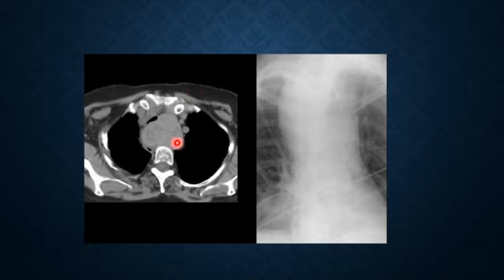As you can see here, the same patient was imaged. It is behind the bronchus. Okay? I'm not talking about differential diagnosis. I'm talking about localization. You see the chest X-ray and you know where the mass is. If you give us the diagnosis, better. For example, this could most likely be a lymphoma or some paraspinal mass. I don't have a pathological diagnosis really. It's just the demonstration of the sign, to be honest.